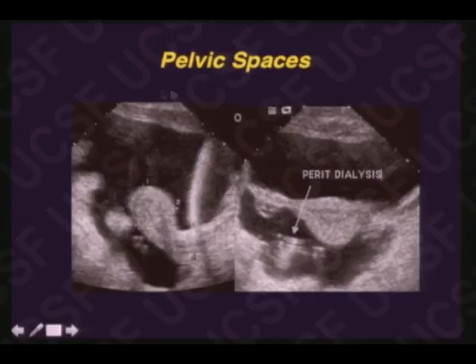But the important thing is, the peritoneal dialysate is a sufficiently powerful mass to completely displace the bowel out of the supravesical space. And if peritoneal dialysate can displace the bowel away, so can an abscess, which is a much more powerful mass in terms of space occupying.